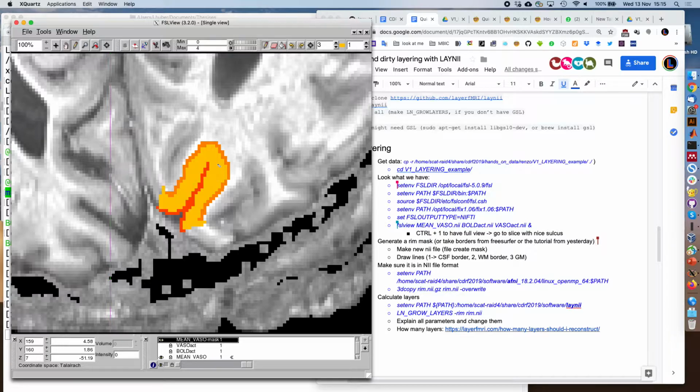Masaki, do you need help? Now you can just change this to 3 and then just close it up on both sides. And then you can use the bucket, so it is here, and then fill it up with 3s. Okay, so you can use the undo button, and this means that you have a hole somewhere. And 3 is the hole. You might need to go back to the pencil.